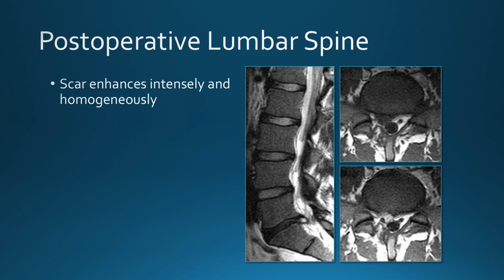And compare that to this patient with epidural scar tissue at L5-S1. So here the whole thing enhances homogeneously with contrast. Also note the nerve root is surrounded by enhancement but not displaced. So typically the scar tissue will not displace the nerve roots.